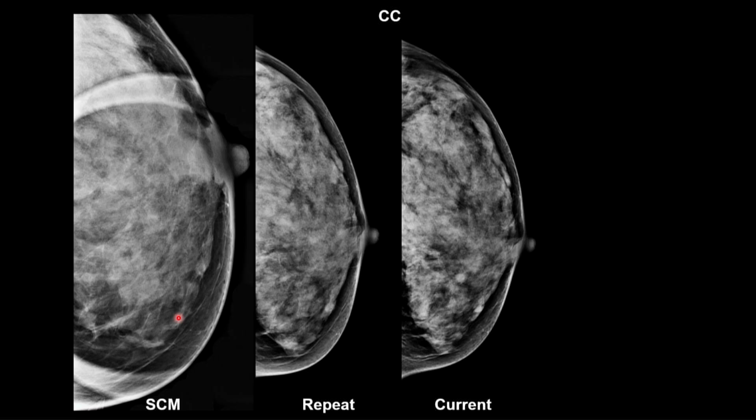So, yeah, go ahead. Within the right breast on this case, it looked to me like there was architectural distortion in the upper central. Okay. Well, if you didn't hear, he's asking about a potential finding in the opposite breast. I didn't mention it at the introduction because this question always comes up. What about, you talked about this, but what about that? And the answer to that is, I hope you're wrong.